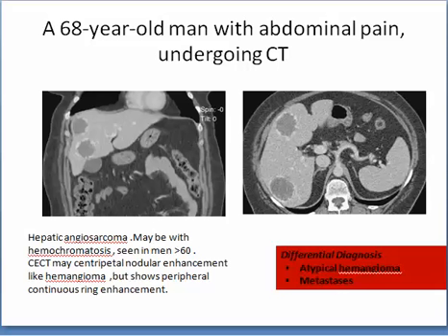This association of the continuous ring enhancement and the centripetal nodular enhancement, similar to that of hemangioma, are pointing to angiosarcoma. An atypical hemangioma or deposits all may be simulating such an appearance, but what is first, so angiosarcoma: multiplicity, ring enhancement, and nodular centripetal enhancement.